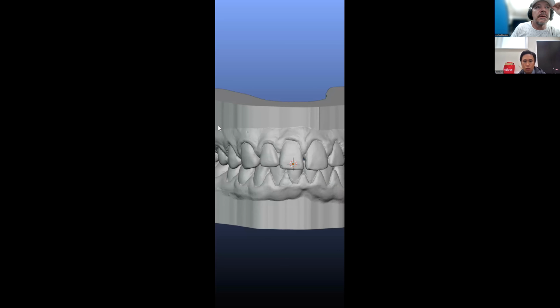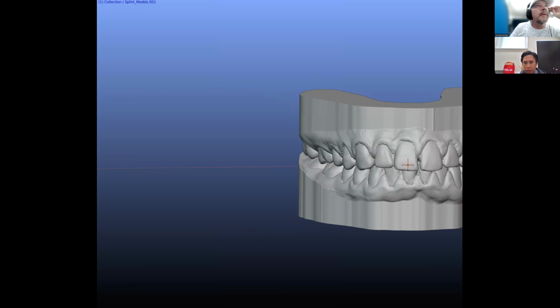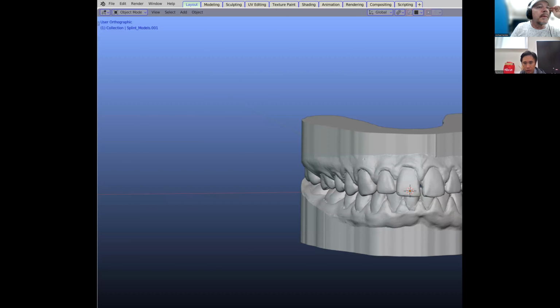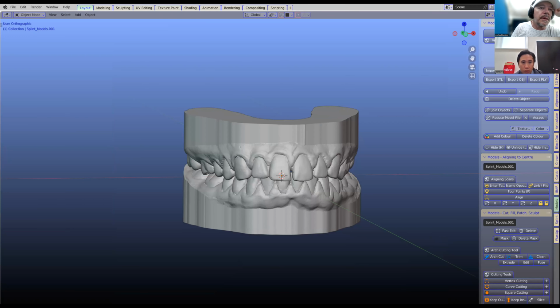So I've just grabbed any random model. What's going on here? What I'm asking for is easily done in the software, right? Because for my application, I need to move the mandible just to a specific location. If that's doable, that's good.